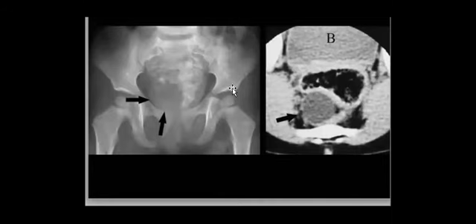An osseous defect on the right side, as you see here, the arrows. And in the CT, what do you see? You can see this fluid-filled lesion. Hypodense lesion. Yeah, hypodense lesion. So maybe it is what is called the Currarino triad. What is Currarino? Sacral defect, deformity, and anorectal malformation. Yeah, perfect. And presacral mass, presacral lesion as here, either teratoma, lipoma, or dermoid.